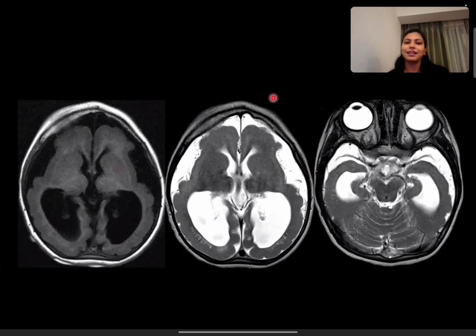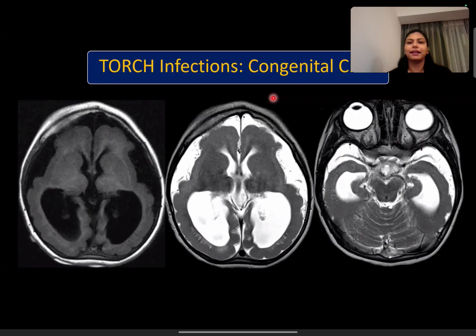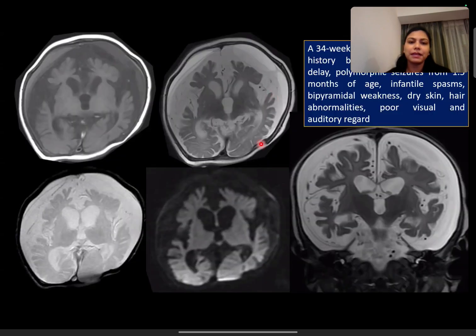In this we are not seeing hypomyelination, I just showed it as a DD of Aicardi-Goutières. Yes, it is a case of a TORCH infection. And in the last lecture, someone told a DD, so I just kept that case, which may be out of context. Maybe sometimes there are associated hyperintensities which may represent hypomyelination, but it is out of context. I'm just showing this because last time when I kept TORCH, some people told that diagnosis.